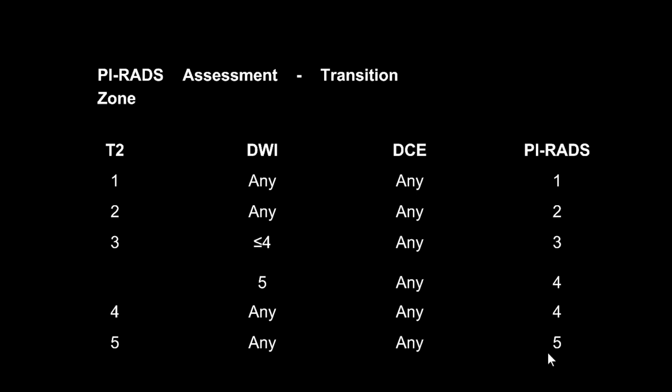So a 1 and a 5 are easy. A 4 is also easy. A 4 is the same as a 5, except the lesion is just simply smaller. It's equal to, but really under, 1.5 centimeters in size, with that charcoal-like, erasure-like smearing phenomenon crossing boundaries. How about a 2? A 2 is pretty easy.